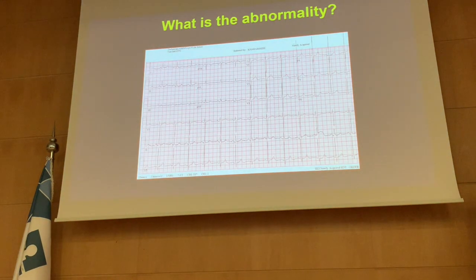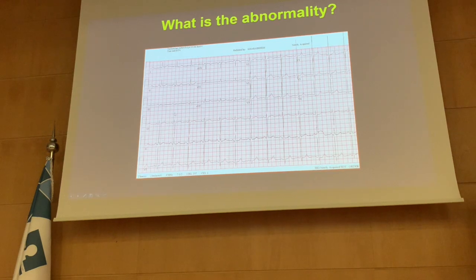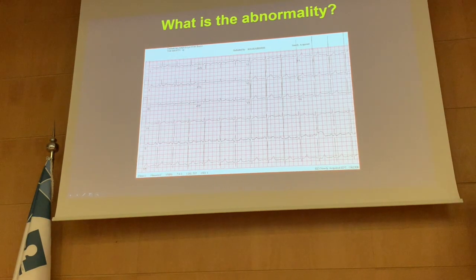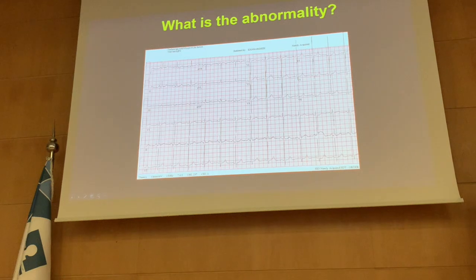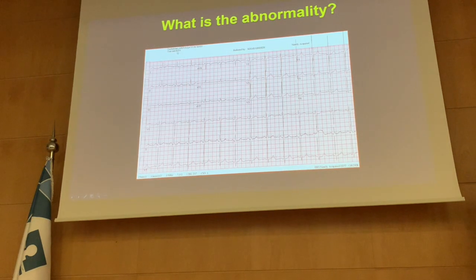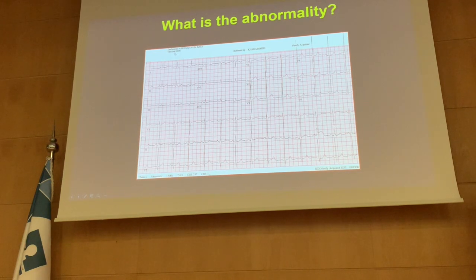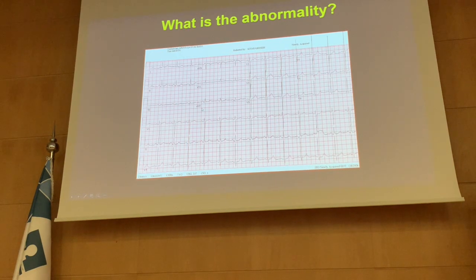Okay. So now we can discuss something else with this patient, also from the cardiology clinic. Sometimes in the ECG we're going to write the clinical scenario. So this patient, as your colleague said, has hypertension, okay, and we are doing an ECG. Is his ECG normal or is there an abnormality?